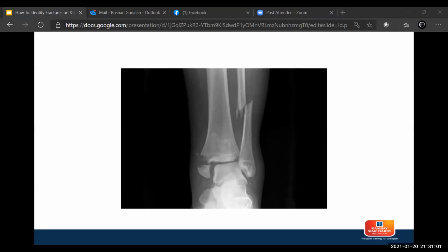Okay, so Atika said volar dislocation of ulnar, left distal third fibular fracture. He said left closed angulated fracture of the tibia. Shamini said distal third fibular fracture.